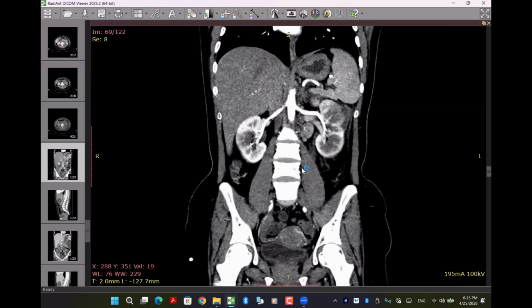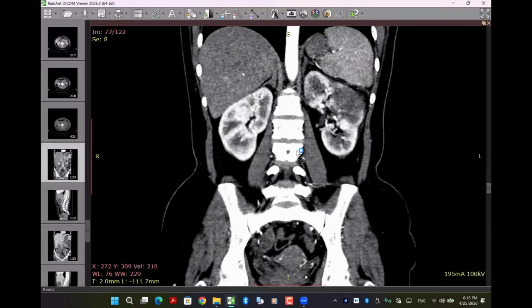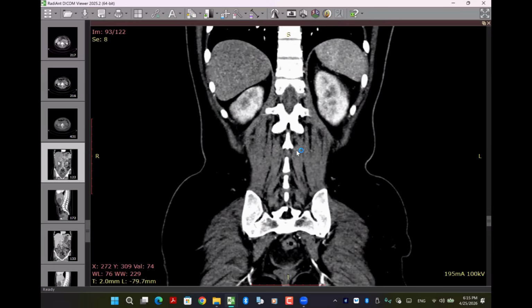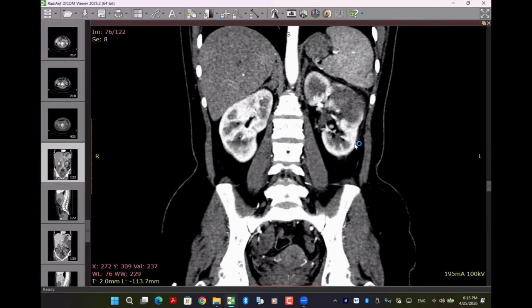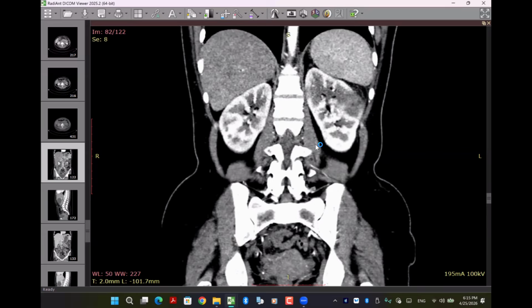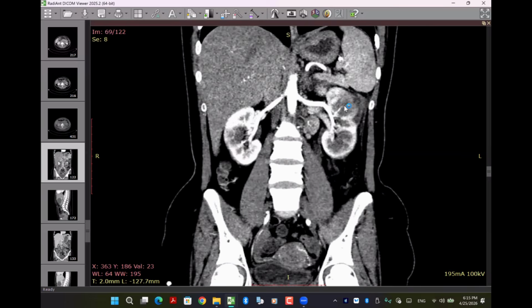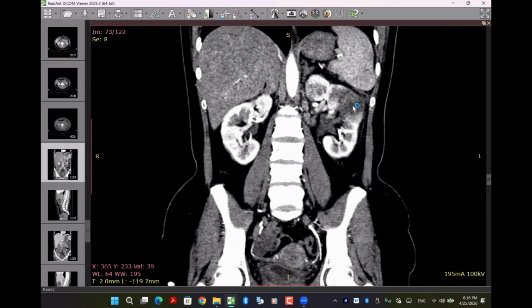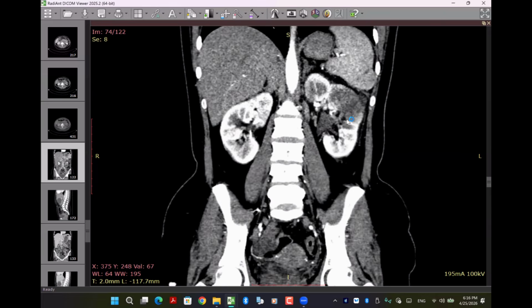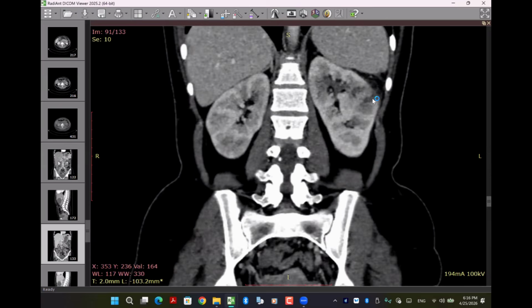Okay, so these are the foci. It could be foci of pyelonephritis with adjacent subcapsular collection formation on the left side. Yes, so it is bilateral multifocal pyelonephritis with subcapsular collection, or you can state it as abscess, because the inflammation is extending into a contained rupture. Exactly, and this is a very clear and classic case for bilateral affection. You can see the second phase here.